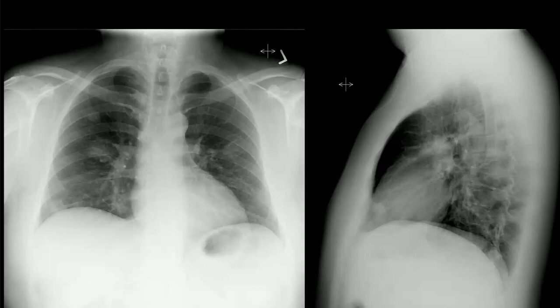Got it. Just a small point. What do you think the shape and the size of the lesion is? Sorry, the characteristics. Are the margins round? Are they spiculated? What do you think about them? For me, one of the lesions that appears to be in the anterior cardiophrenic angle has spiculated and slightly irregular margins. Does it change your differential? Yes, if the margins are irregular, I will definitely put the differential of a neoplastic lesion.